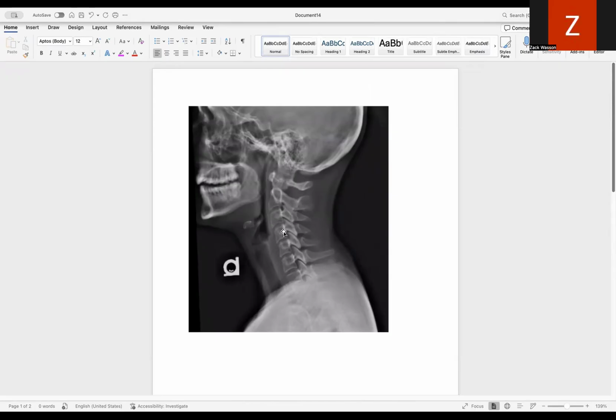You can see kind of the transverse processes, but here's an X-ray image of the face and neck, maxilla, mandible, obviously. You can see even the trachea there as we know. And in all of these imaging modalities, that trachea is going to be filled with air, so it's not going to attenuate the photons like the bone will.